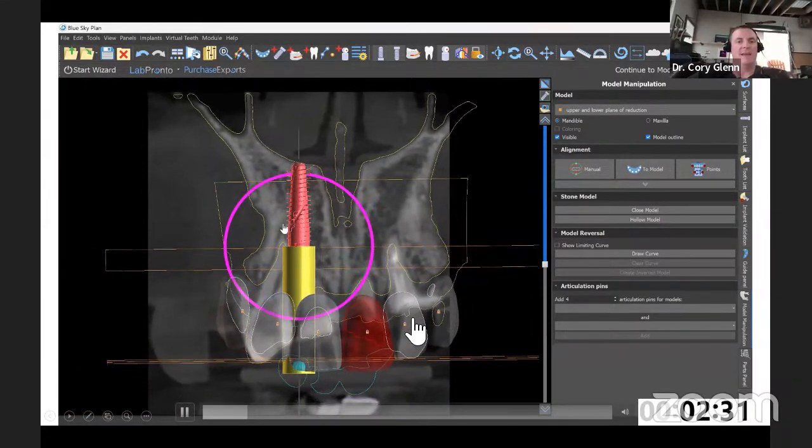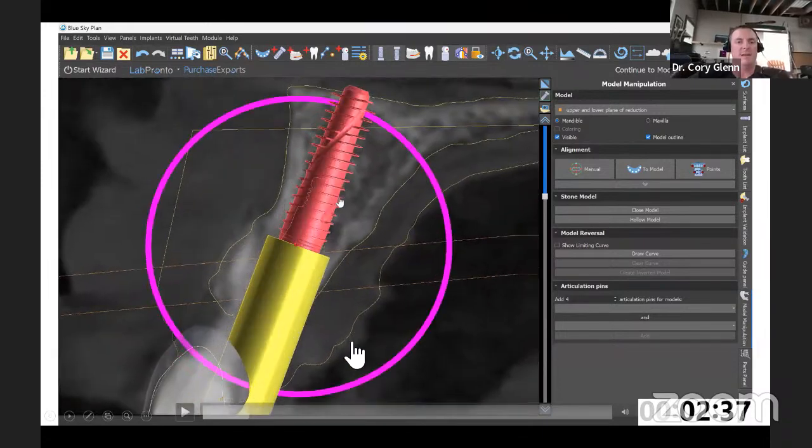I like to start by getting my front 2 implants placed. And if I pause this here, this is a great reference. Remember, the occlusal table is resting on that, so this upper portion represents 16 millimeters. That's the prosthetic space that's needed for a hybrid.